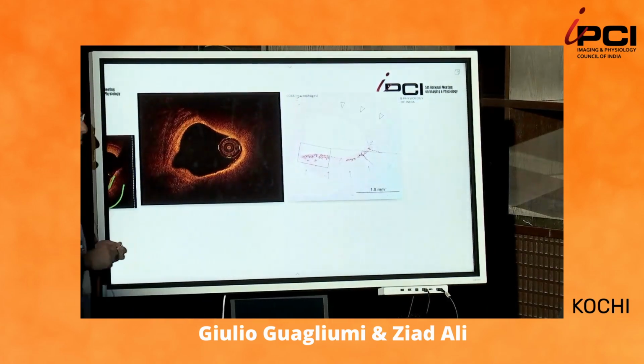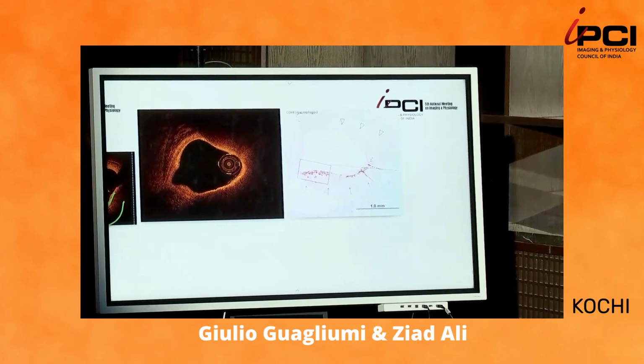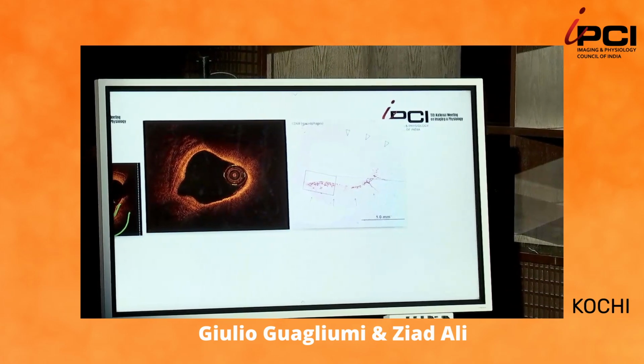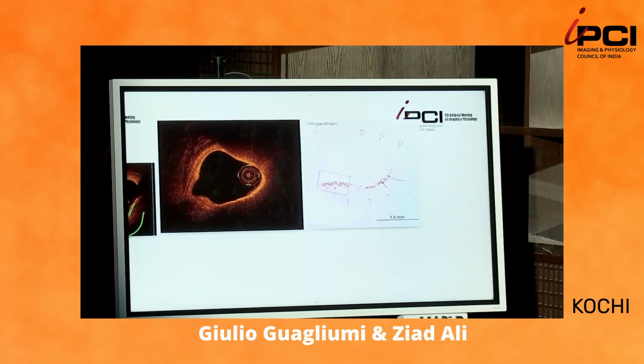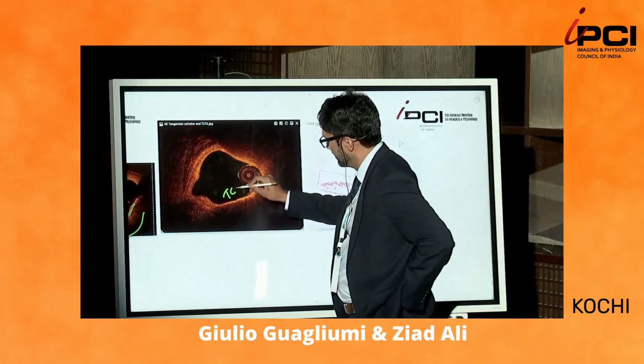We've spoken before. Eccentric position, the corresponding cross-section. Can you show practically which is the risk to have a misinterpretation? We heard about artifacts, and when you have a tangential position of the catheter. So in this case, what do you have to look at?